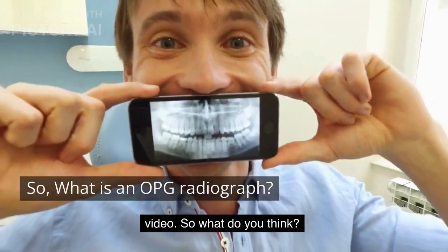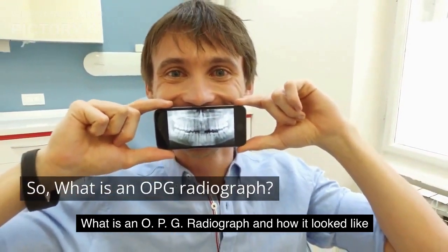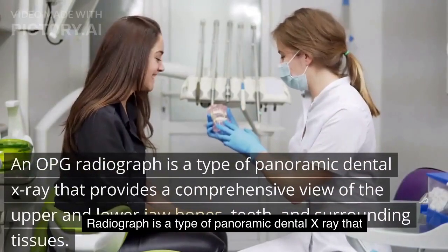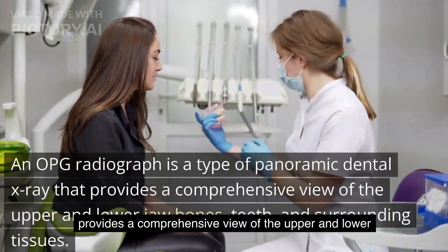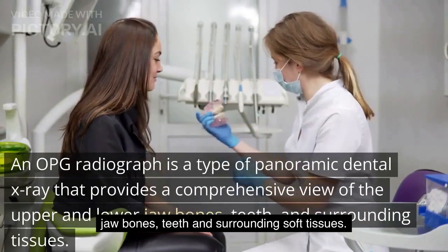So what do you think, what is an OPG radiograph, how does it look, and why do we need an OPG radiograph? The answer is that an OPG radiograph is a type of panoramic dental X-ray that provides a comprehensive view of the upper and lower jaw bones, teeth and surrounding soft tissues.